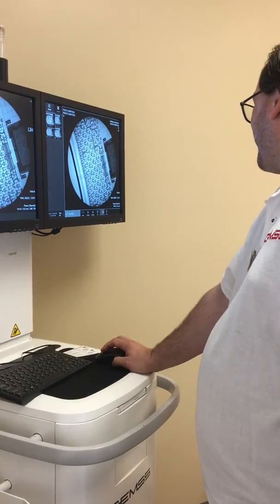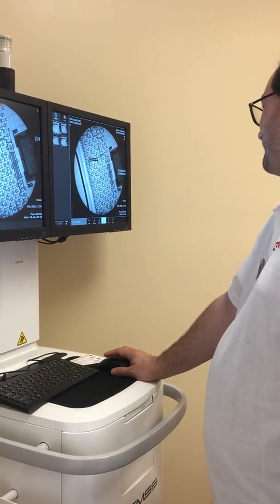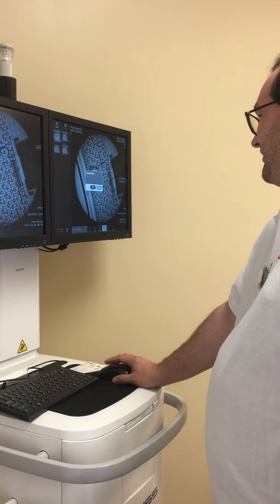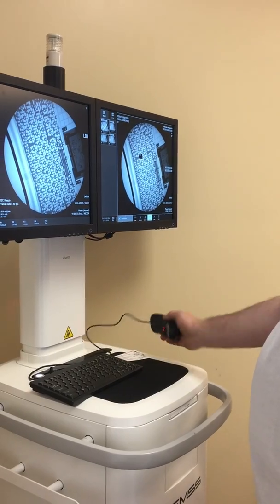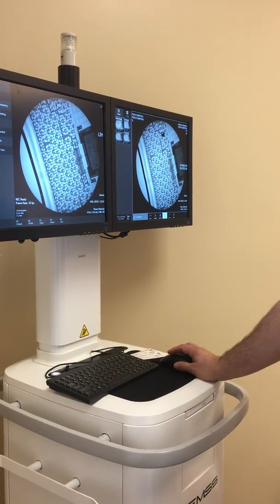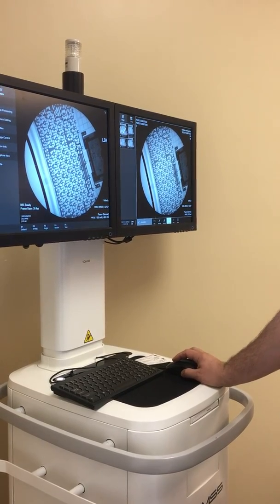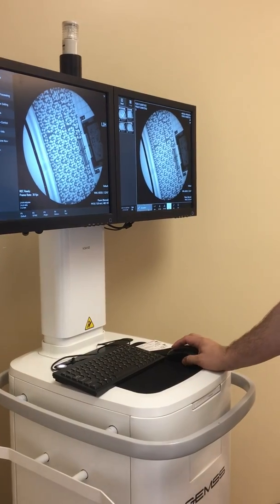I'm not gonna go over all this, you can add stuff all over the image, like normal annotation stuff that nobody ever uses. So there we go. It's real cool. You can put stuff everywhere for no reason.